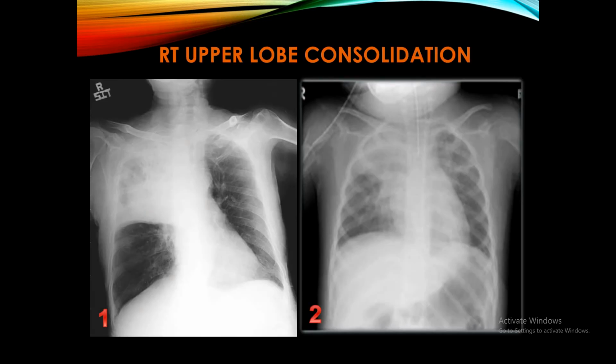This is an example of patchy opacification. هل ناخذ الchest X-ray رقم 1. Chest X-ray number 1 showing patchy opacification in the right upper lung zone. Ill-defined opacification. فإذا we are dealing with a patch. The second step, are there any signs of loss of volume?